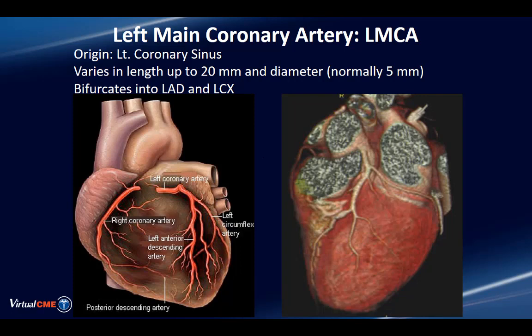And this is normally a bifurcating vessel, but it's a hugely important vessel, because the amount of myocardium that is subtended by the blood flowing down this channel really represents perhaps 2/3, if not 3/4, of the left ventricular mass typically. So we take this artery particularly seriously, and it's nicely rendered in the volume rendered technique that you see on the right compared to showing it on the left.